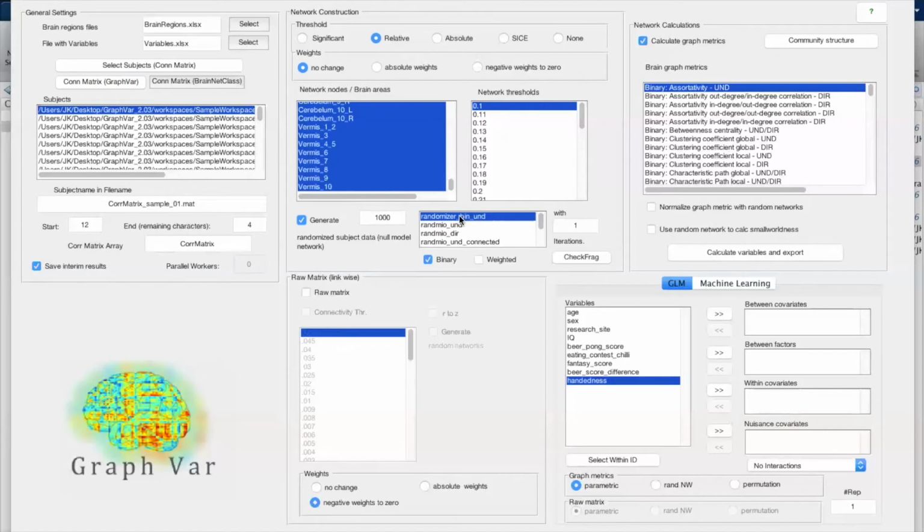There are ones which are for binary, some for weighted specifically. You can choose this here, binary or weighted. You'll have to choose this in addition, because it's thresholded in the respective way. But also look at what those specific functions have in their name.